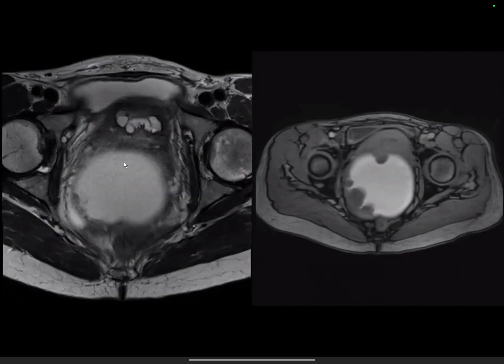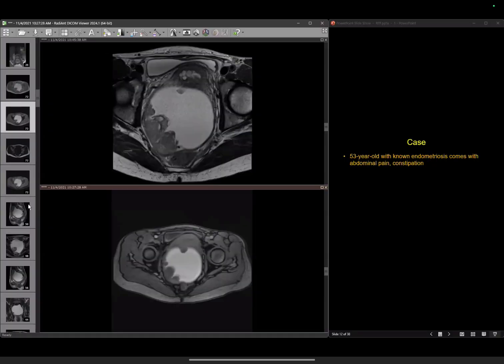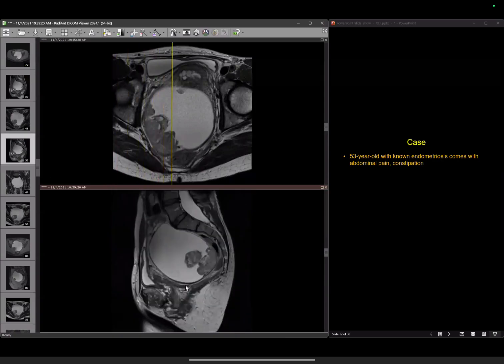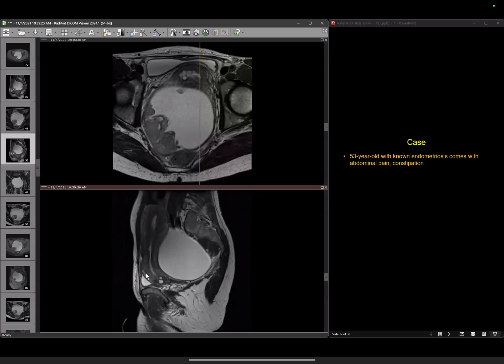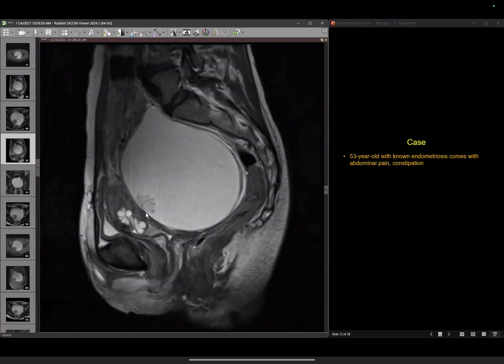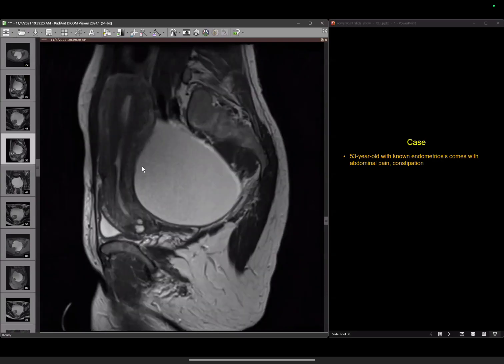So let's first do one thing: for the sake of everybody else, let's quickly look at the sagittal T2 first. Okay, so we start. What structure is this right here? What I'm outlining? Uterus. Sagittal. Does that look normal? More or less, yes, right? I mean, you see, there is no contour abnormality. You see the endometrium. You're seeing the junctional zone, myometrium.